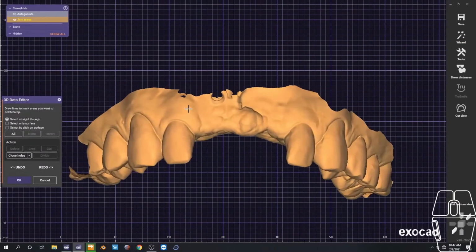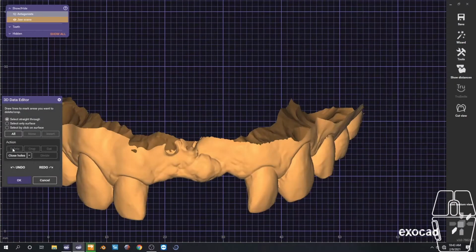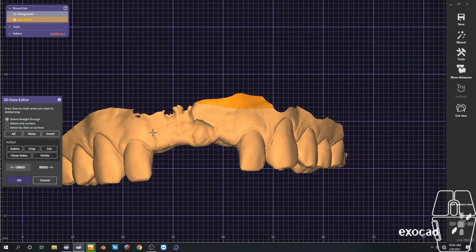And then while you're here, here's a cool trick. Everybody wants to do this. You want to close your loop by double clicking and then either clicking the delete key or clicking over here to delete. Well, what that does is it leaves a fairly ragged edge. I'll show you a better way.